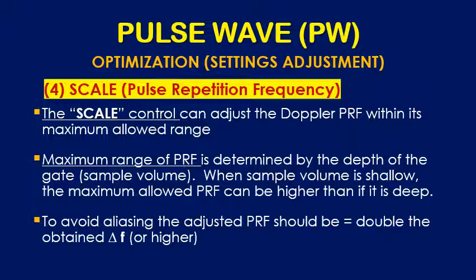I want to see the details of the velocity display. So this is the scale. What is in reality? What is the PRF? The PRF is determined within a range of the setting of the system.